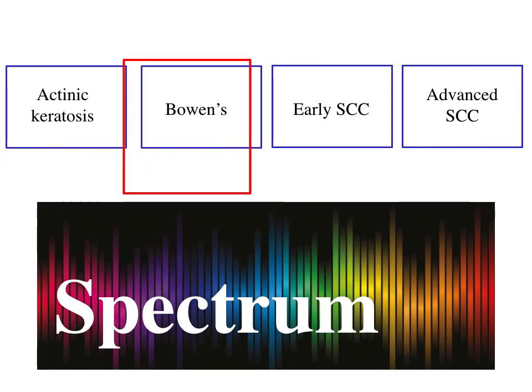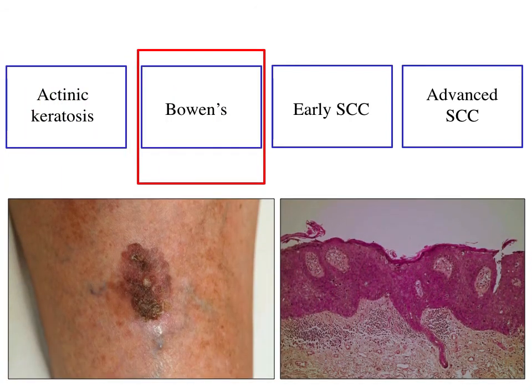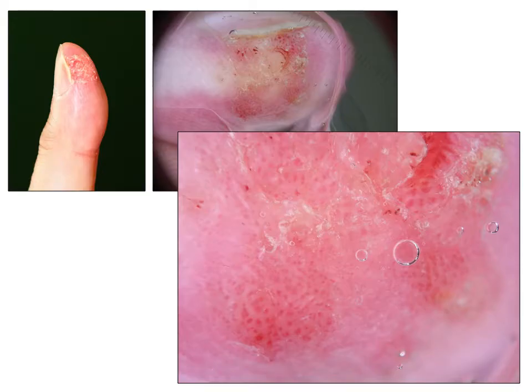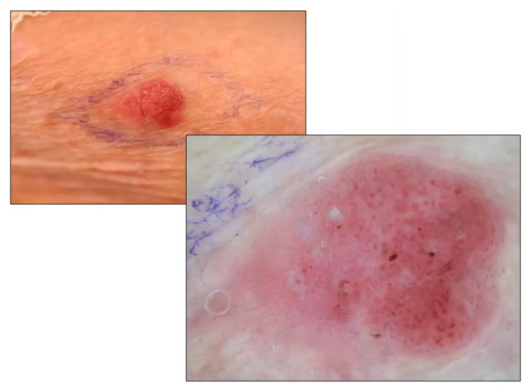Bowen's disease is different. In Bowen's disease, we will observe some changes in the vessels because the papillae are enlarged. And this is why in these flat lesions we observe this glomerular aspect of the vessels. So a typical Bowen's disease is associating irregular squames, irregular in size and irregular in thickness, and glomerular vessels, like in this image or in this image.